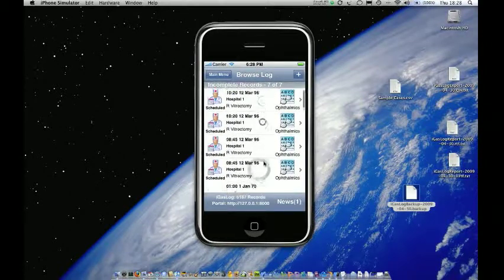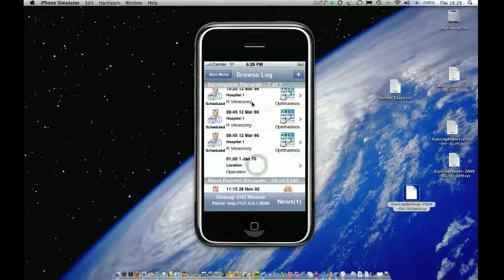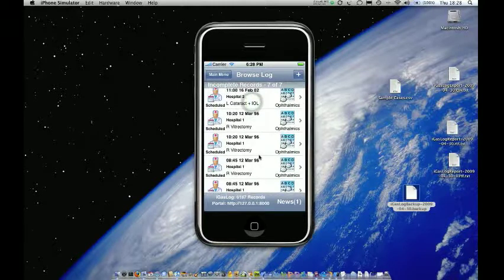Now, in previous versions, people have used the export function to conduct their backups, and that's perfectly understandable because that was the only mechanism that was there. There are limitations to that method. First of all, that only saves your case data. It doesn't save the settings, your registration data, and all that sort of stuff.